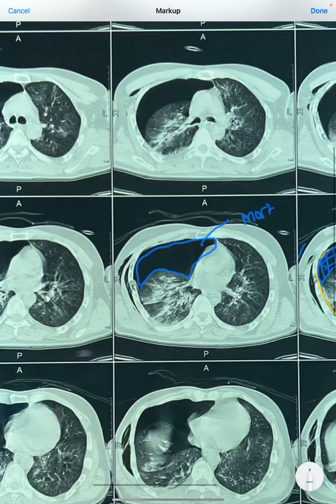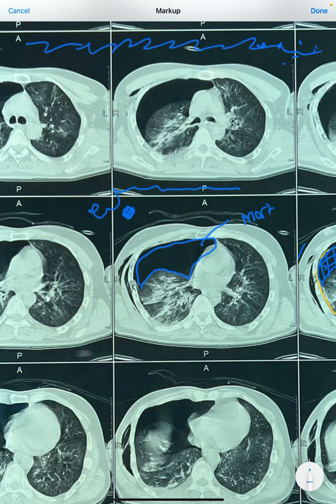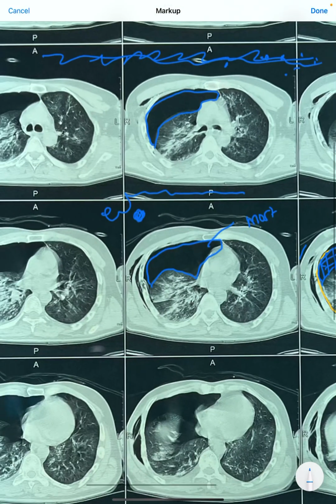Just compare, this is outside of the body and this is all air in the room. This all black color is all air in the room. This is as black as this. So this is typically air which is present outside the lung, inside the body.